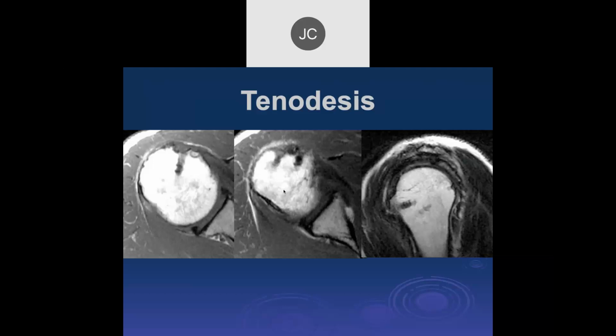Now, since a lot of these patients get surgery at arthroscopy, where you'll see there's a lot of disease of the biceps tendon, they developed techniques to do the biceps tenodesis arthroscopically at the time of the surgery, like was done in my shoulder, which you all saw. So most of the tenodeses I see these days are intra-articular biceps tenodeses, which are done arthroscopically. This actually is an anterior supraspinatus tendon repair, and this was a biceps tenodesis back over here.